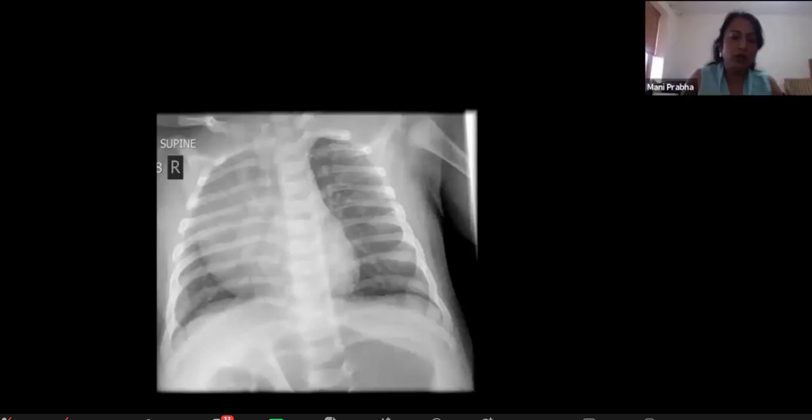This is a neonate presenting with some grunting and respiratory distress. Actually, he presented with tachypnea, and that's why the X-ray was done. That's just tachypnea, no sepsis at all. Anyway, I'll just take over, because the time is short and I want to complete this.